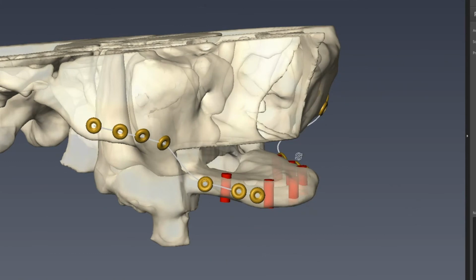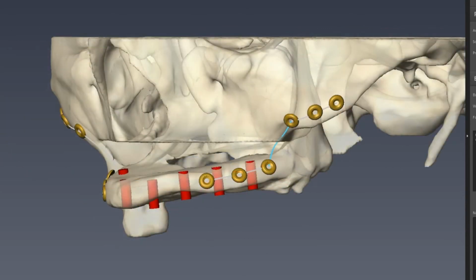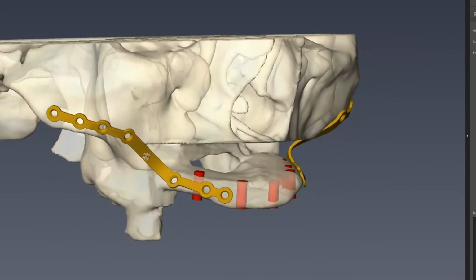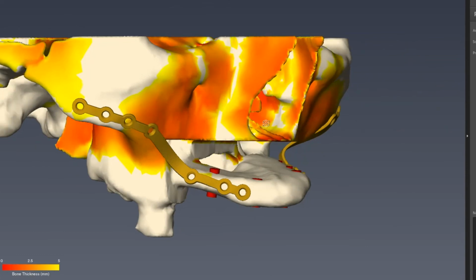Okay, great. Do you want to add any extra strength to the plate on this one by increasing the bar width, or just leave it as is? So we can increase the width. The current width is at 2.5, and we can add up to 1 millimeter. The point of this is if we're struggling with screw placements on limited space, you can get increased strength from the plate. You can see here the width is adjusted. The profile is the same. It's just adding more material in this dimension. It's good. We'll do that. No, that's fine. I like that.